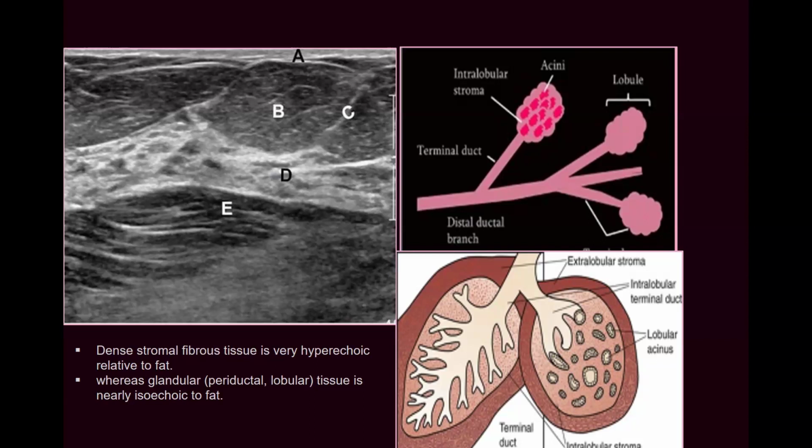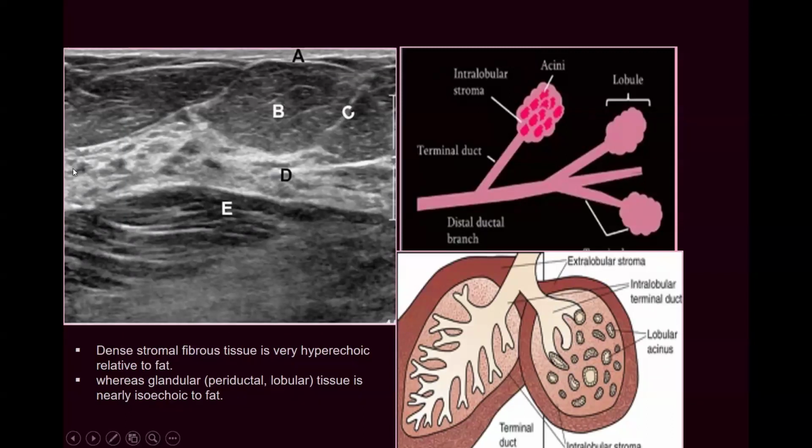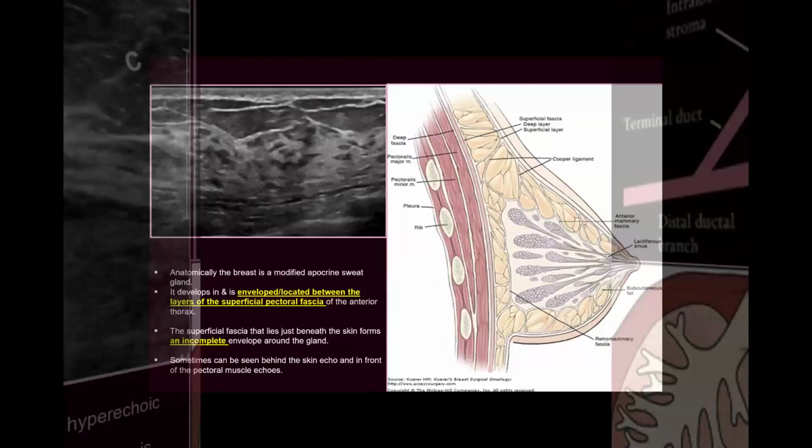This is the compact stroma, the brightish one. It appears as hyperechoic, representing the whitish hyperechogenicity here within the mammary zone, and these smaller grayish areas represent periductal and intralobular stroma. Is it clear? Okay.